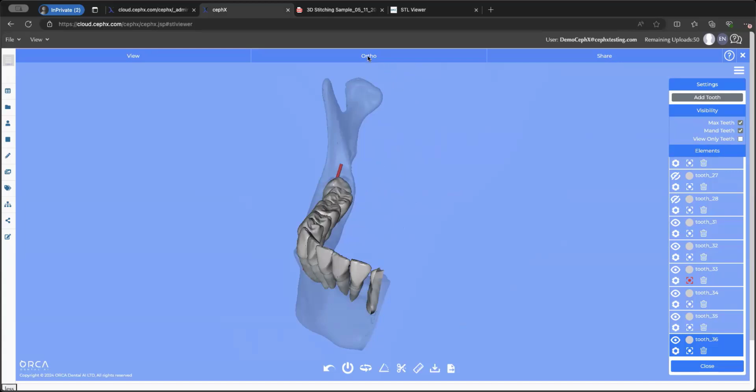We also have an ortho section where you can actually play around and move incisors. We're just coming out with it next week, so there's no real point showing it right now. But the point is, when you build stages, you can play around with the anatomy. You can move teeth around individually and get the changes in the gingiva, and then accordingly save the stages and see a video of the stages playing. So there's a lot of different features available.